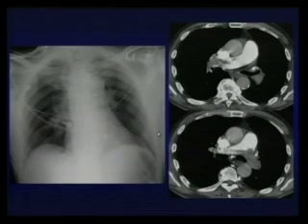This is another patient that was in ICU. You can see the endotracheal tube, and you can see that there are prominent hilar regions, very large pulmonary arteries, and you can see that there is an abrupt difference between the size of the vessel distally and the vessel centrally located. Because of this difference, we can suspect a bilateral oligemia caused by a bilateral pulmonary embolism that is shown in this PE.